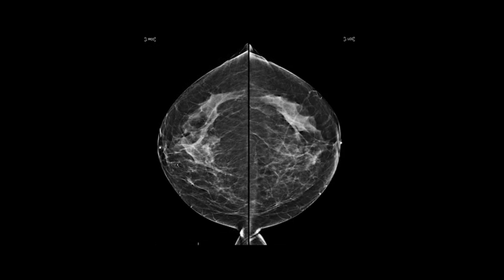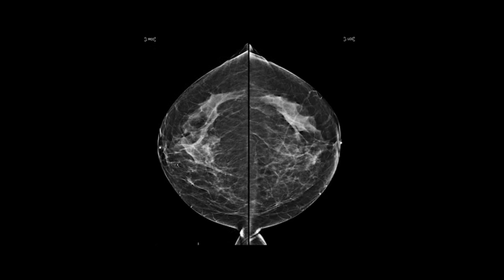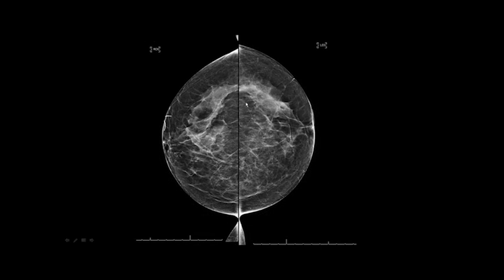The patient came back, and you could see the difference. Nipples are perfectly centered. There's a lot of retroglandular fat. You see the end of the parenchymal patterns on left and right breast. You have good lateral tissue and good medial tissue. So if you could go back and look at the previous images that got called back, you could see the difference. Look at that. There is about a centimeter to a centimeter and a half missing posterior.